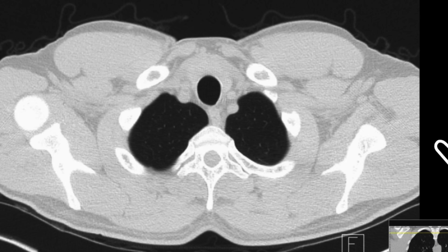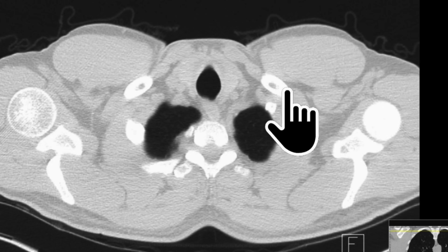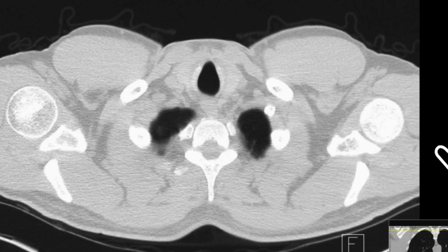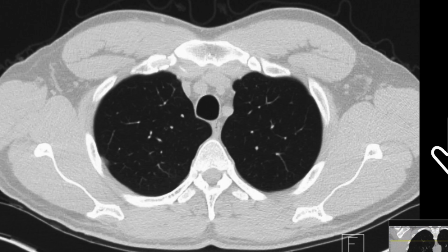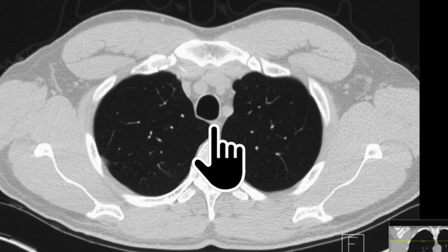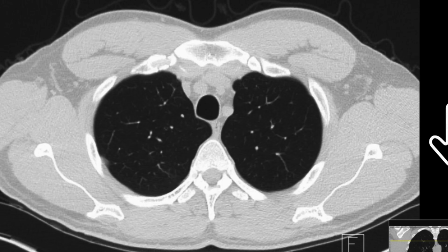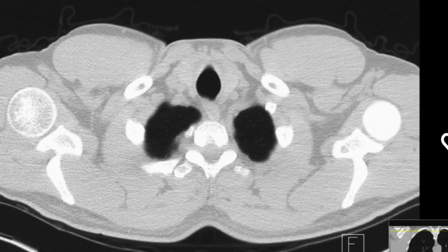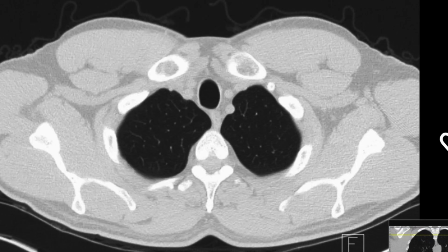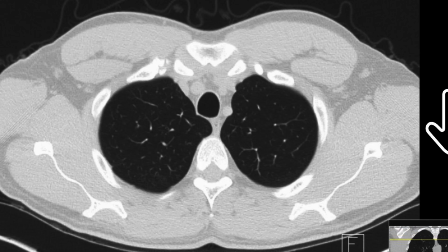That one is closest to the lung. It's changing shape because it's changing direction, because it's going to the upper limb. That one is staying round because it's still going up. And that fits what we were expecting. We were expecting the first branch to be the brachiocephalic trunk, the second branch to be the left common carotid artery, and the third branch to be the left subclavian artery. And if we follow either of these 2, scrolling back up again, that's where they go.